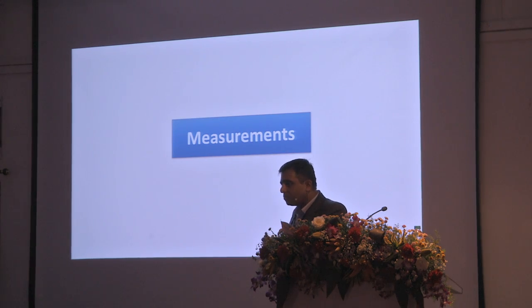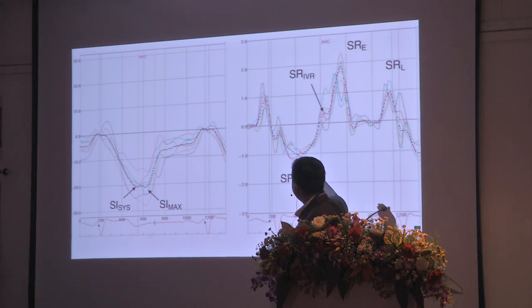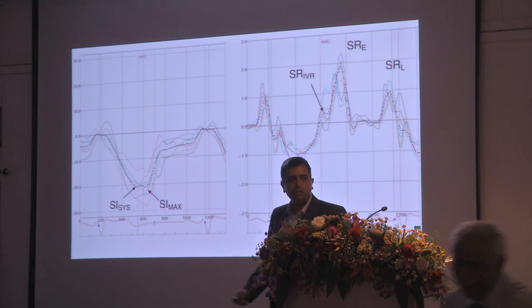Now, I'm going to very quickly go through what we are going to measure and how we are going to measure it. Okay. So these are the strain rate curves here on our right, and this is our strain curve on the left.